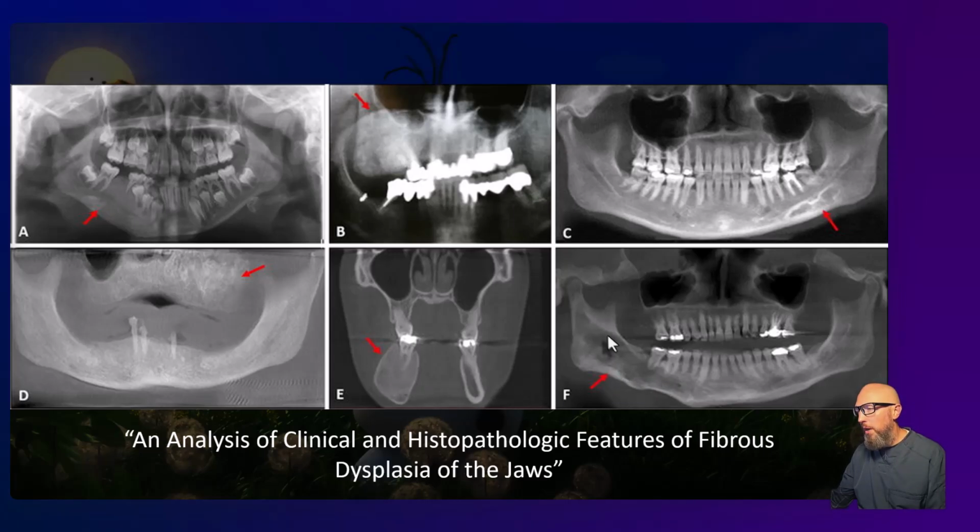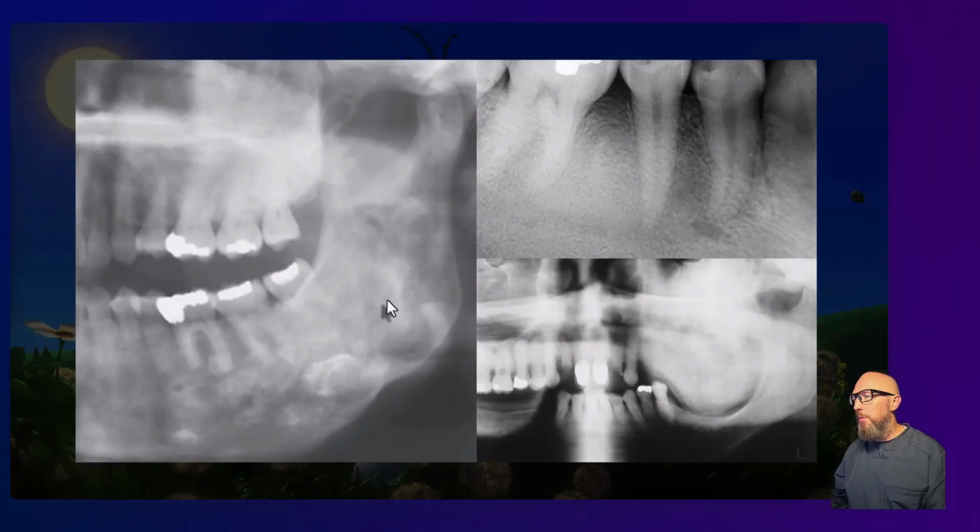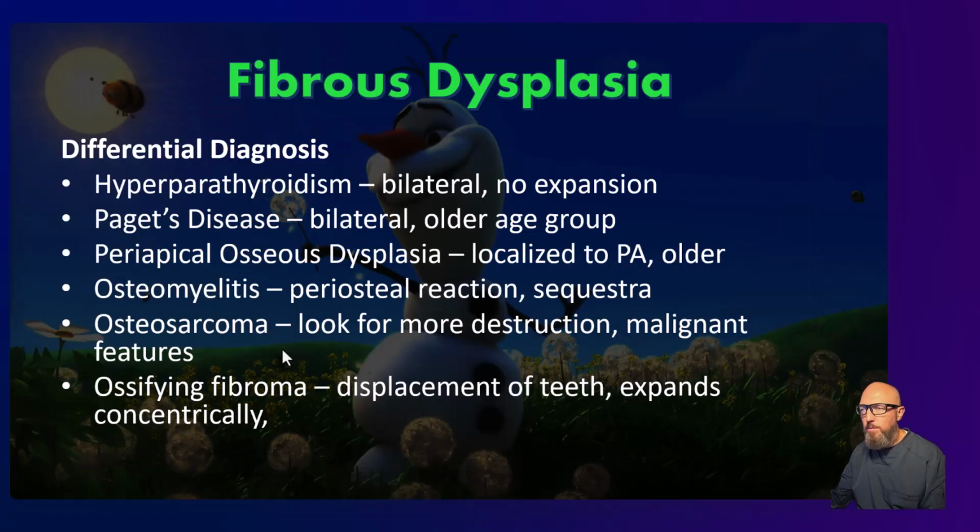A little bit more rare one where it's more lytic, more radiolucent, but again, originating below the canal. Think fibrous dysplasia. Here's that cotton wool appearance one. Here's more of our ground glass, maybe even getting toward that fingerprint appearance. Here's one that filled in the maxillary sinus, but it's really grown extensively from there, even growing down toward the mandible.